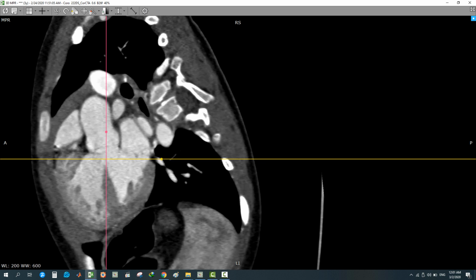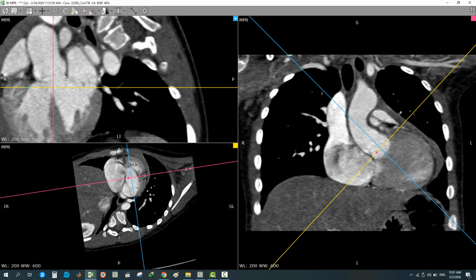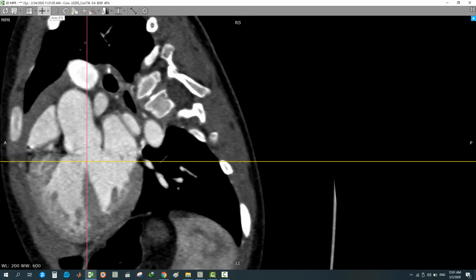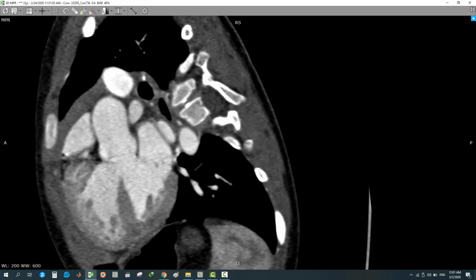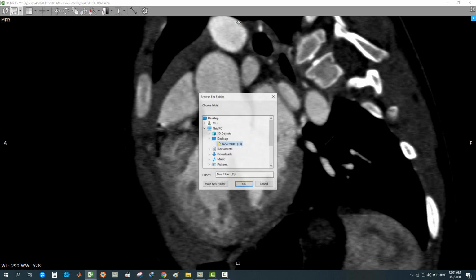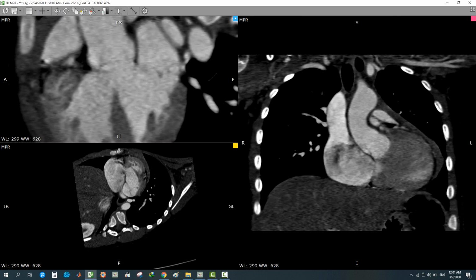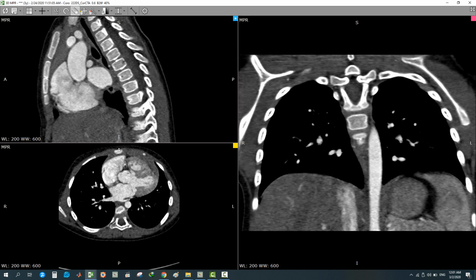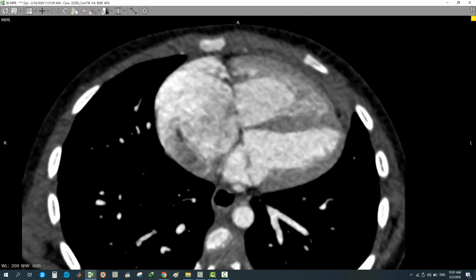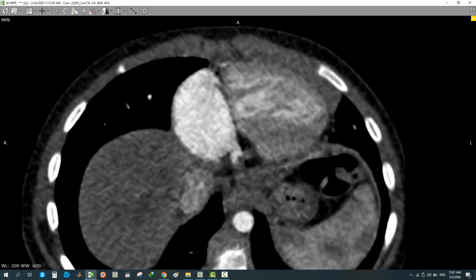Okay, midway, and this one is the length of the VSD. An overriding aorta, conoventricular VSD with an overriding aorta 50-50. Okay, you can easily save this image. Okay, I will reset again. No other VSDs in diastole. See it in systole and diastole. Revise it in systole like this. No other or no additional VSDs.